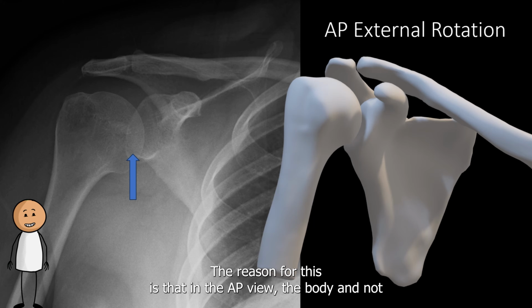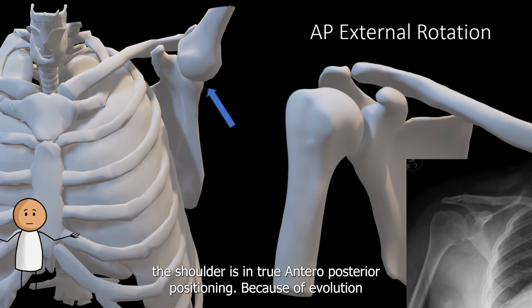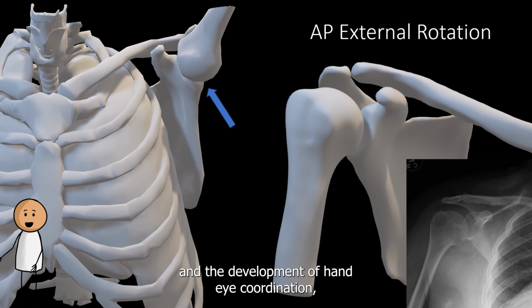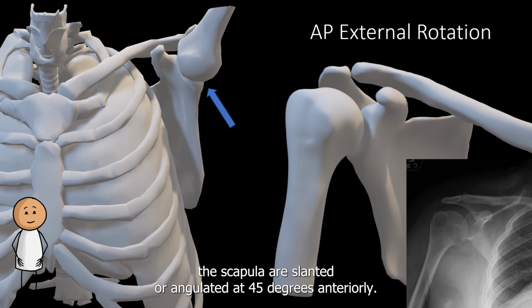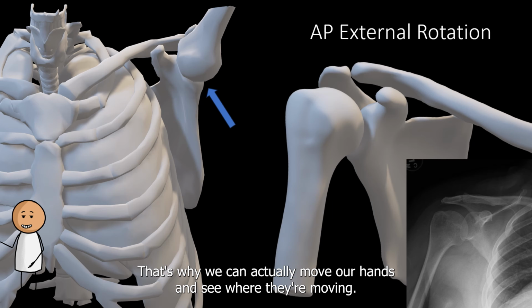The reason for this is that in the AP view, the body and not the shoulder is in true anteroposterior positioning. Because of evolution and the development of hand-eye coordination, the scapula are slanted or angulated 45 degrees anteriorly, so in the AP view, the humeral head is lying in front of the glenoid and not adjacent to it. That's why we can actually move our hands and see where they're moving.